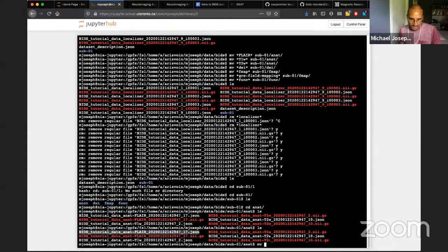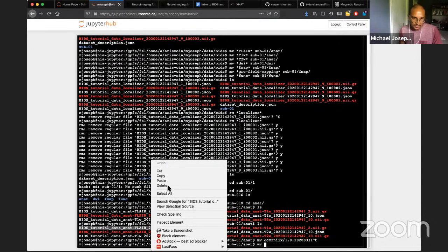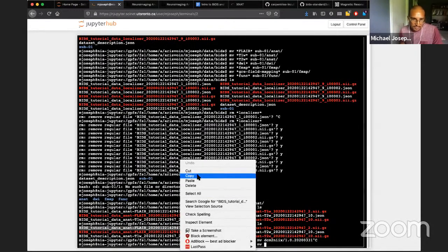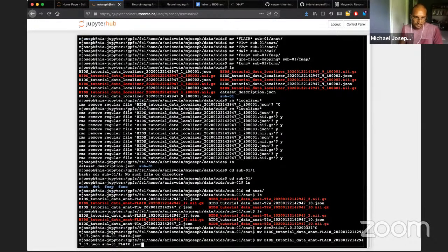So we're just going to rename the files by moving them. So we'll call this sub-01_FLAIR.json. And we can do the same thing with the NIfTI.